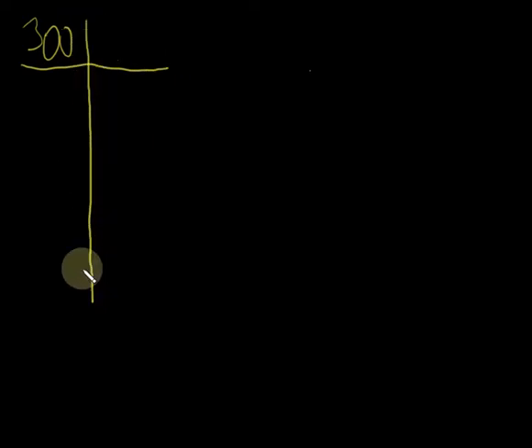So I'm going to start out our chart by drawing 300 up here in the corner. Now if I take that and we were to look at a heart rhythm, and let's say that the heart rhythm is regular, because for this technique, it really needs to be a consistent heart rate. The beats need to be the same distance apart, otherwise this doesn't work quite as well. I'll show you a couple workarounds on that, but that's why this 6-second rule applies to most of the rhythms you're going to deal with and works just fine for our purposes.